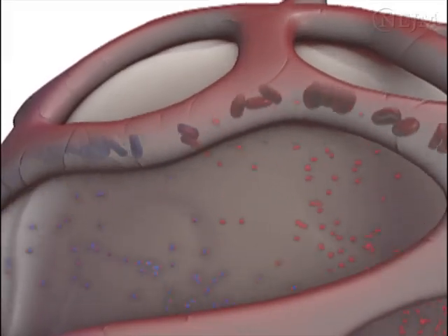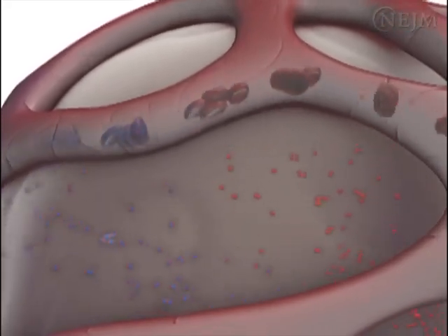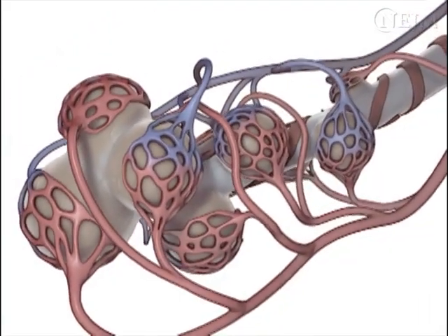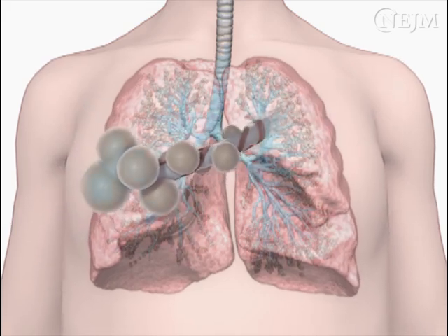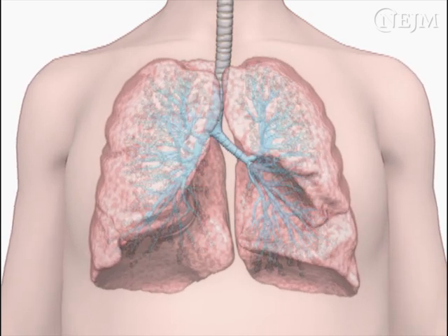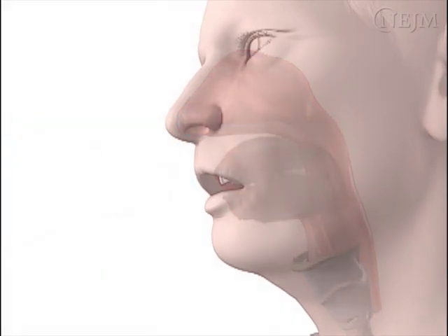Overview. Carbon dioxide is generated in the body as a metabolic byproduct. Carbon dioxide dissolves in the blood and is transported in the bloodstream until it reaches the lungs, where it diffuses into the alveoli. The alveoli are ventilated through an open tracheobronchial tree and a patent upper airway. Carbon dioxide can then be detected in the patient's expired breath. The measurement of expired carbon dioxide provides insight into important life-sustaining processes that include metabolic, circulatory, and respiratory activity.